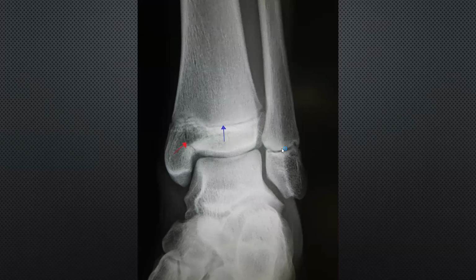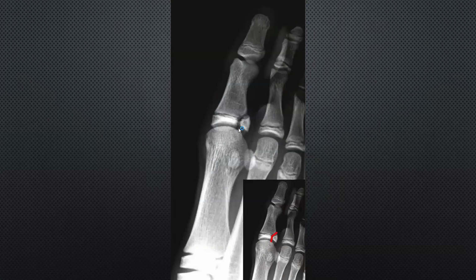If this one is a fracture, is it type 1, 2, 3, or 4? Type 1. And this is type 1 and this is type 3. Clear, guys? Yes, sir. But if he has pain here only, then it is only type 3. I hope it's clear. What about this one?